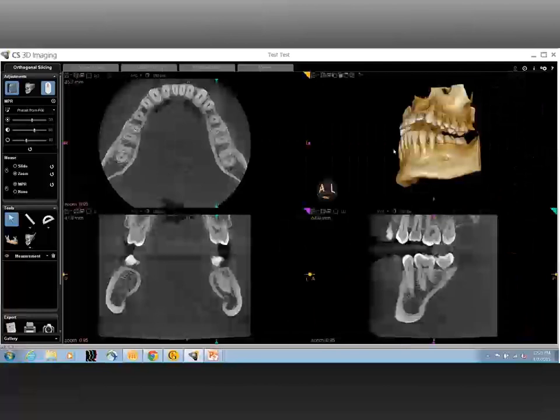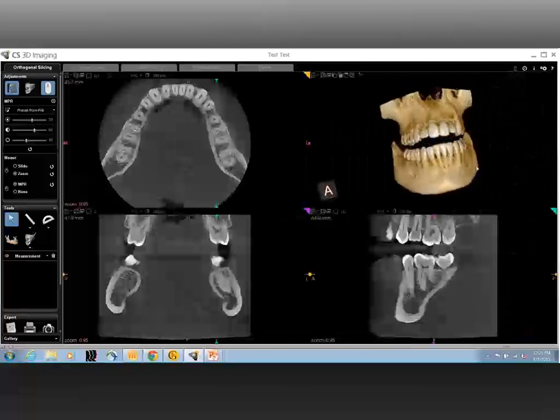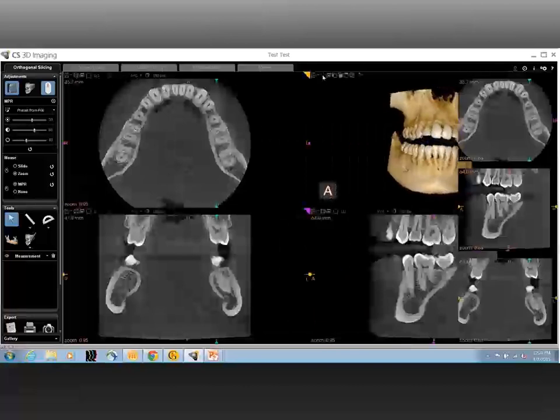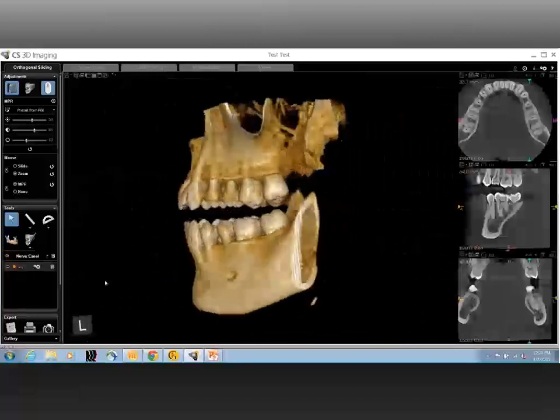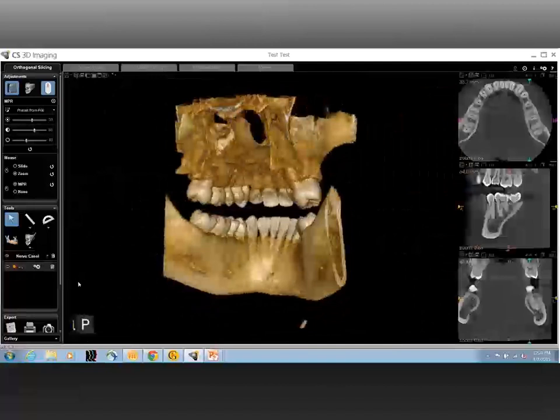To pick up from the previous question, yes, that is absolutely correct. Those are the three things to start with. And of course, as we expand the horizon into interpreting or going through the images, a few things to look for. Number one, inferior alveolar nerve canal. Now, everyone knows that that's one of the most critical structures that exists in the mandible. So identifying the inferior alveolar nerve canal, identifying the course of the inferior alveolar nerve canal is very important.